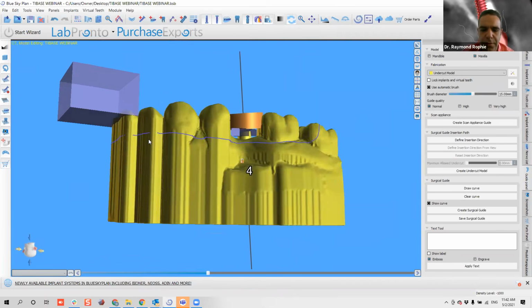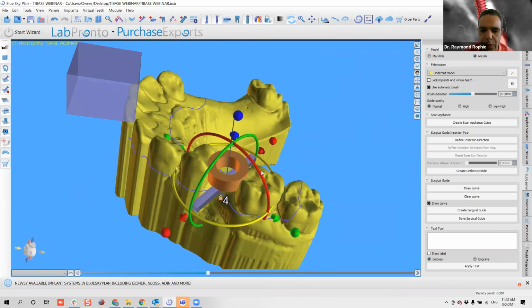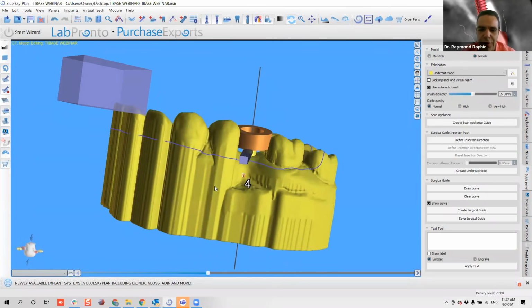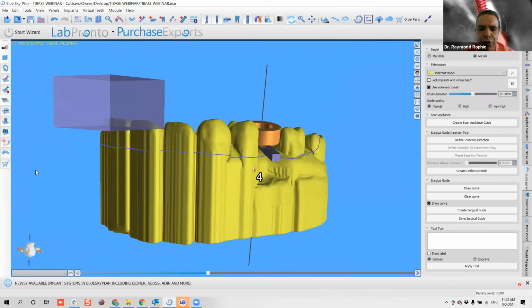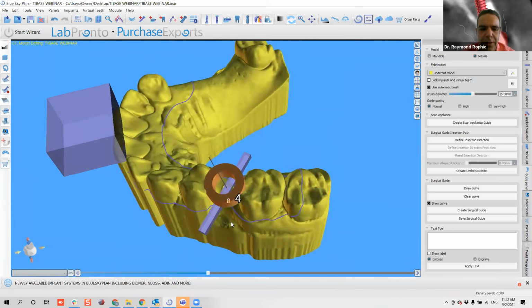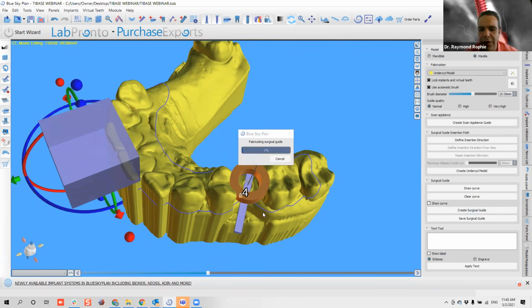As well, if you need any guiding for the timing of your implant, you can use windows. There's a ton of that. I could make a one-hour webinar on how to use windows. So what you can do now is position the windows that you want. This will basically be planning the holes that you want in your surgical guide. Then you click create surgical guide. After we do this, we customize our surgical guide. We will create a set of articulated models, export, and that's it.